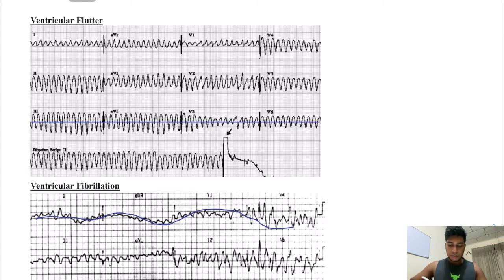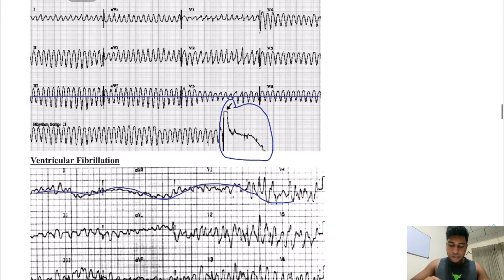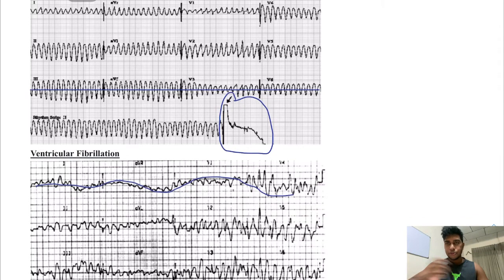Okay, and just think about what happened here. Just take 2 seconds and think about what happened here. So basically what has happened here is they have removed the ECG leads. Okay, if you get situations like this, just don't panic. It just means the lead was removed.